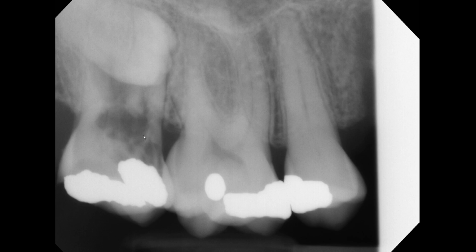But the features that I see here would also force me to certainly consider external resorption, where if you look at the way these are resorbed, I don't see a nice smooth outline or blooming effect of internal resorption, but rather it looks like it's been somewhat irregularly resorbed. Additionally, this area, it's a little difficult to say whether there's recurrent caries underneath or not, but presuming that this is a part of resorption rather than caries.